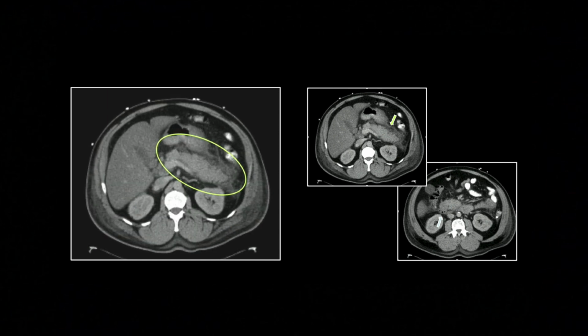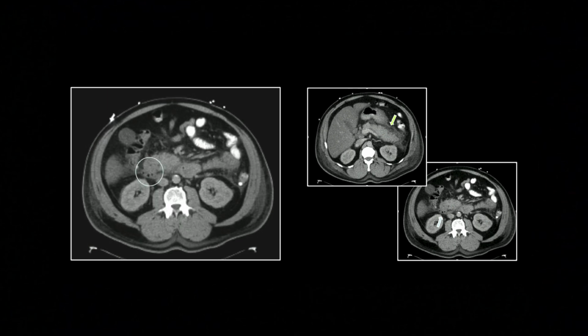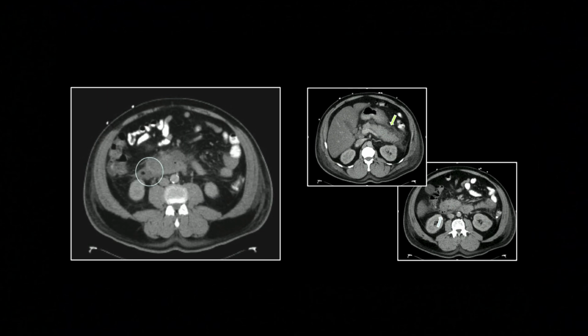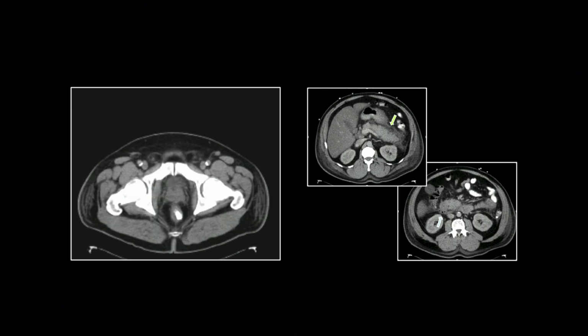Right, so there is the inflamed pancreas. Again, that's moderate, maybe even moderate to severe. That's a lot of fluid. And there is a classic location of retroperitoneal gas related to a duodenal perforation.